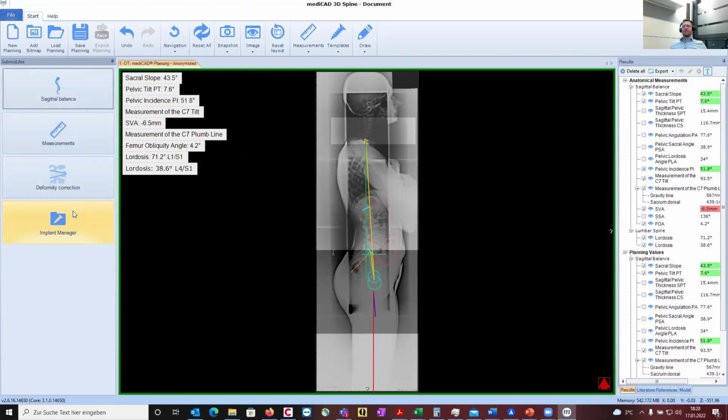But this is, again, something I want to show you in the 3D module. If you have more interest in the other modules or the other subsections in the 2D module, just write me a short email, or write me something in the chat, and then maybe I can tell you something more about that later, or after the webinar.